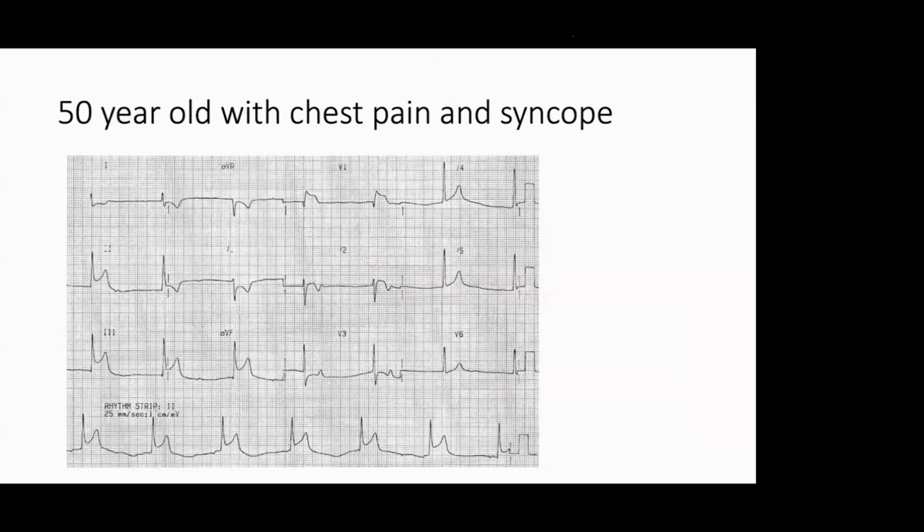Hypotension. Having RVMI, hypotension will be there. Then one more thing is there, cause of syncope. A hypotensive patient will not usually go blackout. They will have fatigue and sweating and all those things. Blackout is one more thing you have to look for. When you look at the P wave and QRS relation, P wave is there, but not related to QRS. So it's a complete heart block.